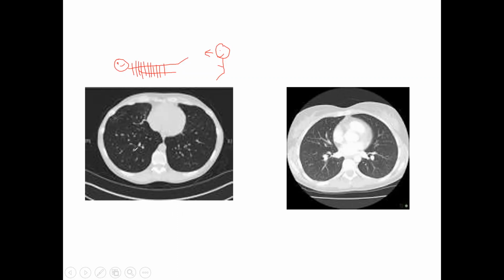So ultimately when we look at either one of these CTs, this is the patient's back. So if this is the patient, then this is going to be the patient's right lung. This is going to be the patient's left lung. Now, both of these have relatively healthy looking lungs, normal lungs. So I wanted to show you that for the purpose that you might take somebody to CT for that. You might even take someone for CT angiography if they're assessing for pulmonary embolism or anything of that nature. So just keep that in mind.